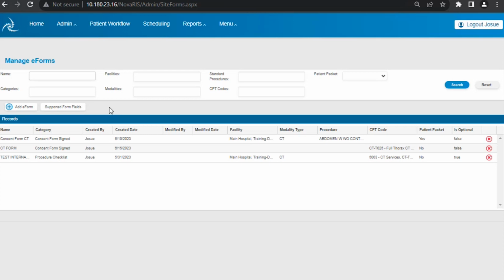One of them is that now your patients could use any electronic device. They can use tablets, smartphones, or even other computers to receive those documents, see them electronically, or in this case, basically open a PDF, see that PDF, also fill in that PDF information, and then send it back into the RIS. And then the RIS will be able to save that copy of that filled document, and that will also be saved as part of the patient documents or the specific order documents, right?